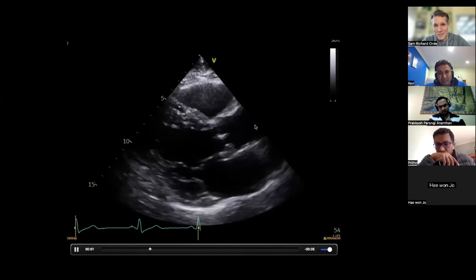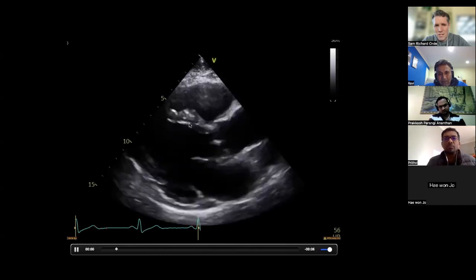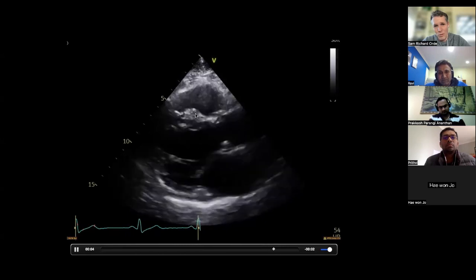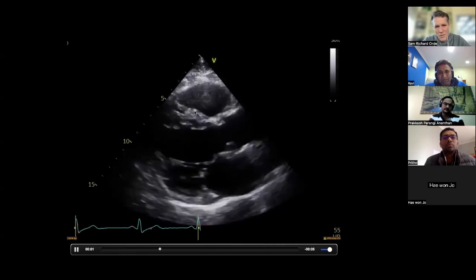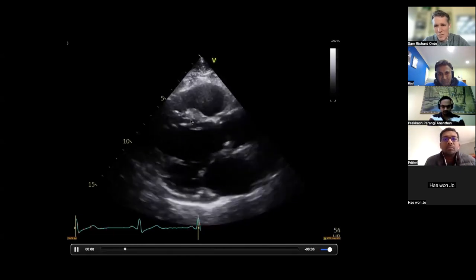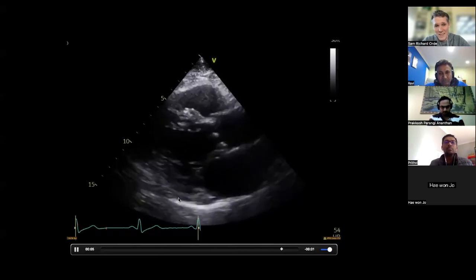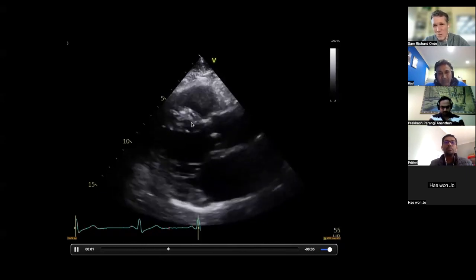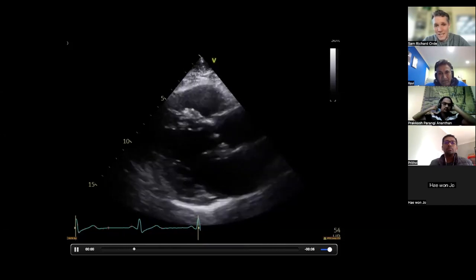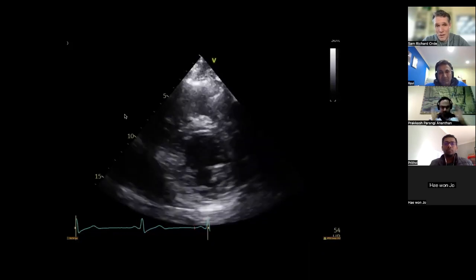Yeah. And I think that's what's challenging about this case. I think we're dealing with some acute and some chronic changes. On this one, I think the posterior wall is much thinner than the septal wall, right? So this anteroseptal wall, I think that's not the wall. This wall is here. So it's about 11, 12 millimeters. I think this back wall is about 5. And I think it's not thickening quite as much as this wall, which is thickening. Again, I don't think it's pass or fail, but I would have called this hypokinetic at the back and potentially chronic.